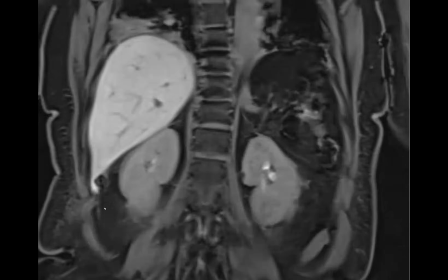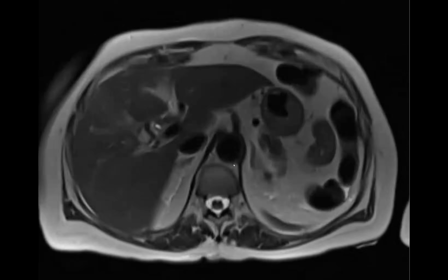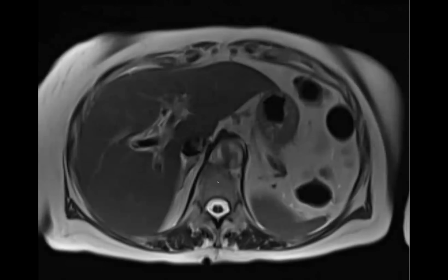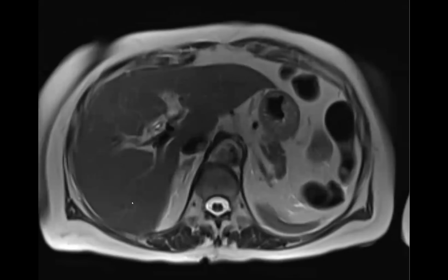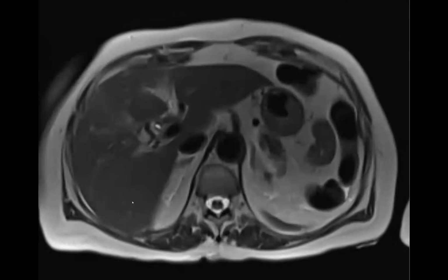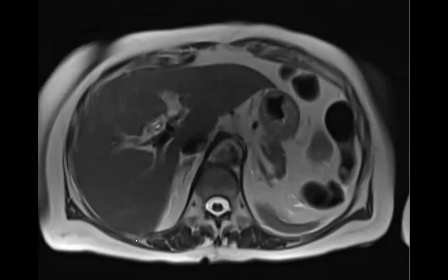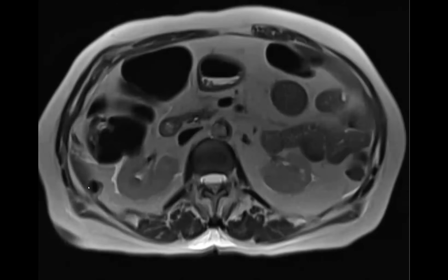Oh, another cute thing in this case. Dropped gallstone. Did you see it? Yeah, it was more apparent on the T2. Yes, exactly. Also on T2, if you see the posterior segments of the liver, they're slightly hyper. Segments 2 and 3 are the normal intensity, but 5, 6, 7, 8 look slightly hyper. Okay, what do you make of that? I don't know, is the liver congested, edematous? Looks slightly brighter, or is it just... Maybe, I don't know, but this is the dropped gallstone.